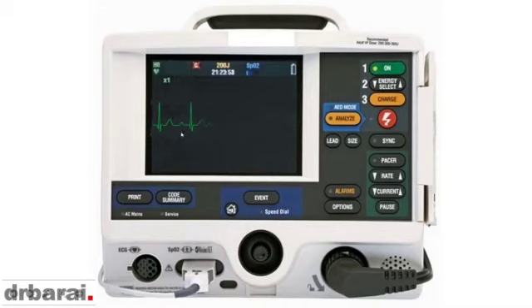If we get a little bit more detailed here, you can see that the PR interval is prolonged. There is progressive prolongation of the PR interval followed by a dropped beat. There is a P wave but no QRS complex. This is called the Mobitz type 1 second degree atrioventricular block, Mobitz type 1 heart block. It can lead to further complications like a third degree heart block, but Mobitz type 2 is worse.